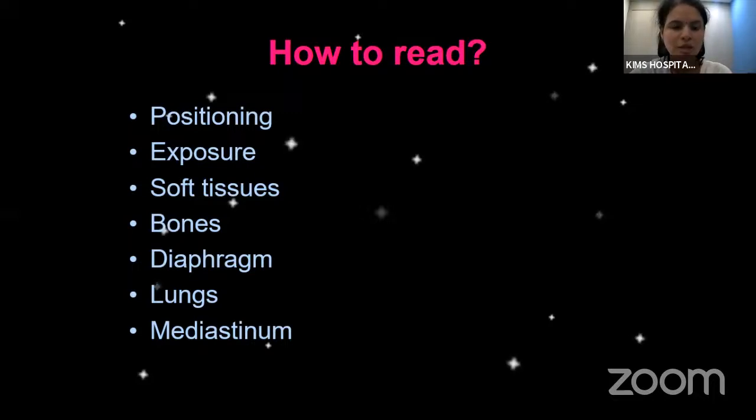So this is the next thing that is to be commented. The type of X-ray, such as AP versus PA view, may also need to be mentioned while reading the X-ray. Often when it comes to newborns in the NICU, we are talking about AP views unless it is otherwise mentioned.